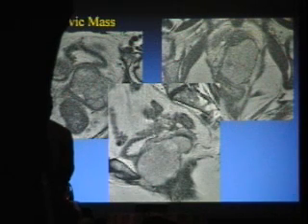Okay, remember that CT I showed you at the beginning? These are a little noisy, but this is the MRI in that same patient. If you remember that CT that showed a pelvic mass, the patient was coming for staging CT. The question was, is there bladder invasion, is there rectal invasion? IV contrast had been given, not much oral contrast. The IV contrast had not made it down into the bladder, so you didn't see the bladder contrast. So let's look at this now in MRI.